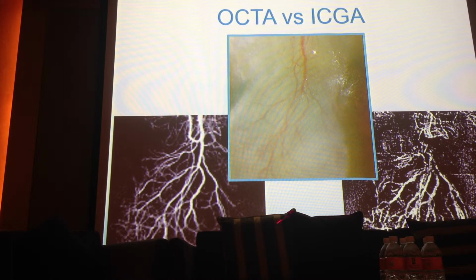by increasing the transverse signals. That means any flow that's going transverse, because all the retinal vessels only go this way. Hardly any vessels come axially towards you. So the algorithm compensates by increasing anything that's transverse, sacrificing any axial. So if the vessel comes down this way towards you slightly and then goes down again, or loops upwards towards you, then you lose some signal. So that's one of the things we were discussing in the paper.